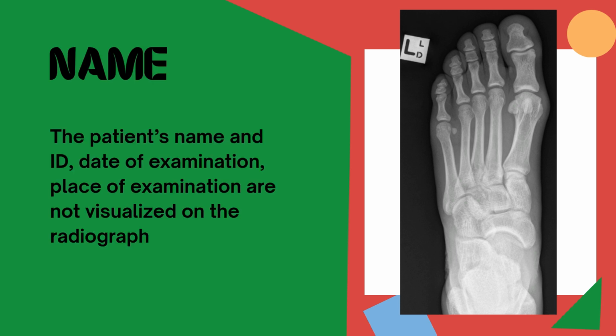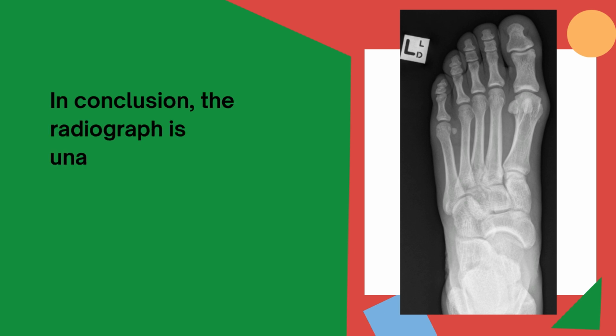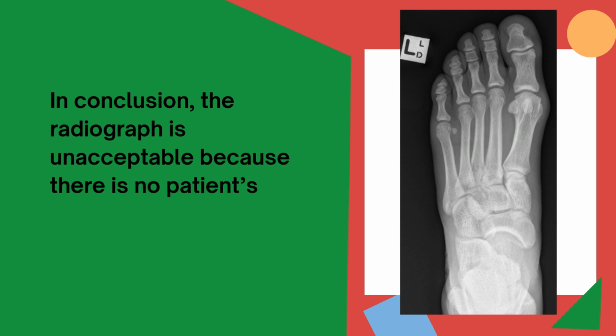The last component of PACEMAN is name. The patient's name and ID, date of examination, place of examination are not visualized on the radiograph. In conclusion, the radiograph of an AP left foot X-ray is unacceptable because there is no patient's identification, which is a very crucial component for radiograph.